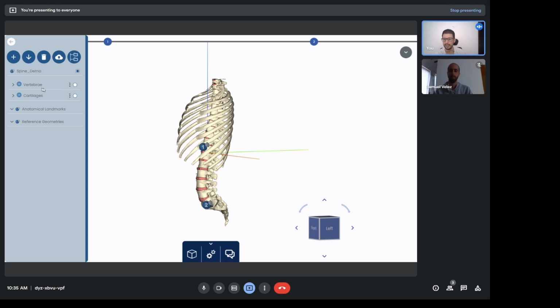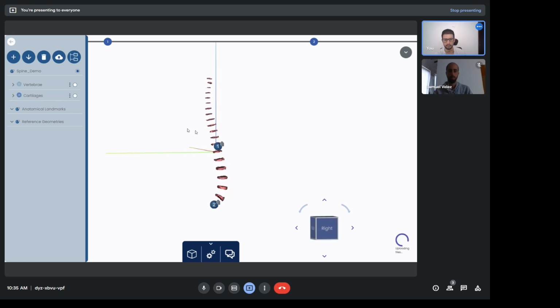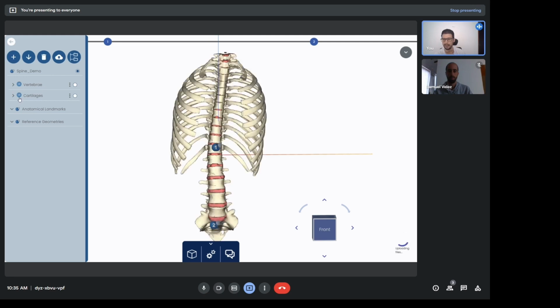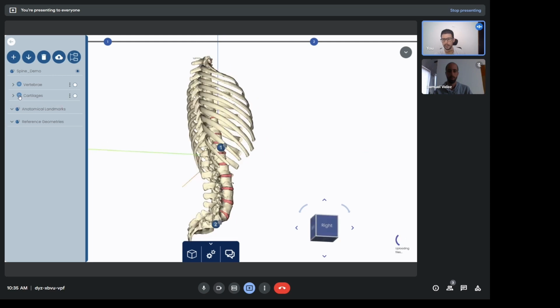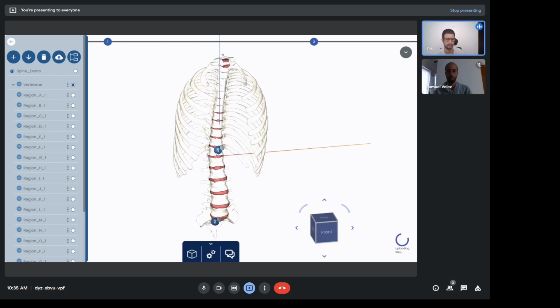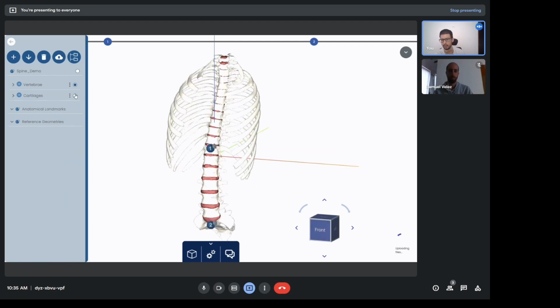So here you can see that you can hide or occlude overall sets. For instance, I'm displaying here only the disc in between the vertebrae, and you can hide the cartilage here and just show the bone structure. You can go a little further than that and select an entire set, and in that way, if you're going to do a translation operation or such, you should be able to move the whole set altogether by switching one of these two cases.